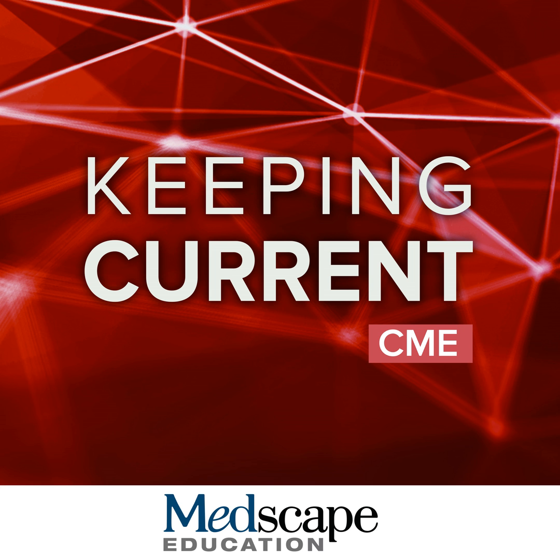Another artifact which we alluded to already is the segmented cine acquisition that's shown here on the left, where you have a lot of motion precluding accurate assessment of disease or wall motion. In this instance, you do need to revert to real-time cine imaging. So switch from the segmented approach to the real-time approach and see that with the real-time imaging, the image quality is not as good, but at least it allows you to be able to determine whether the heart is functioning to any great degree or not.